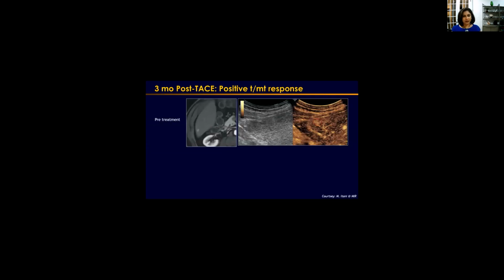When we evaluate lesions following TACE, a positive response would be no enhancement. In this particular case, there was a small lesion which post-contrast ultrasound showed intense enhancement. Of course, we learned that the treatment cavities are usually larger to kill the microscopic metastasis along the tumor margin. But at the same time, we see this perilesional enhancement, which sometimes may be thicker on one side and very uniform on the other, which may create confusion.